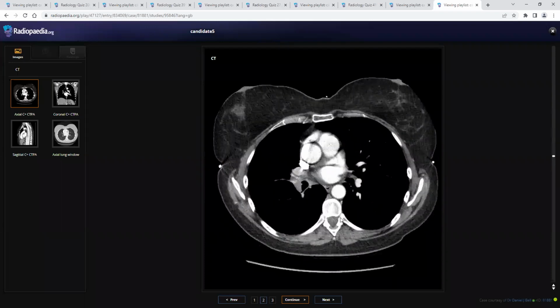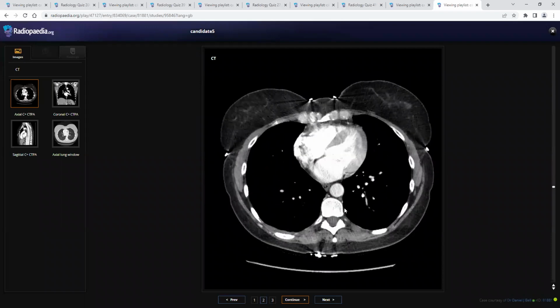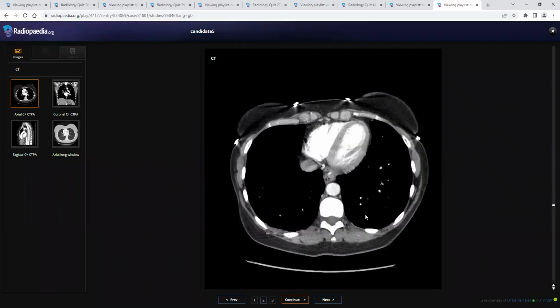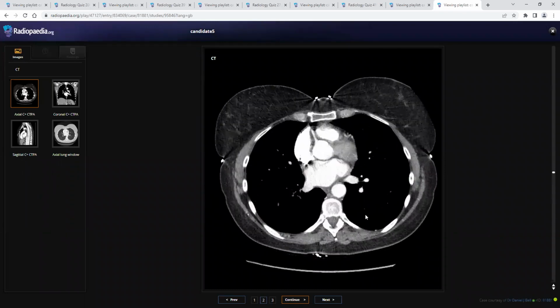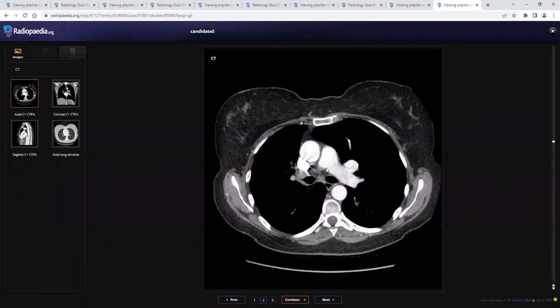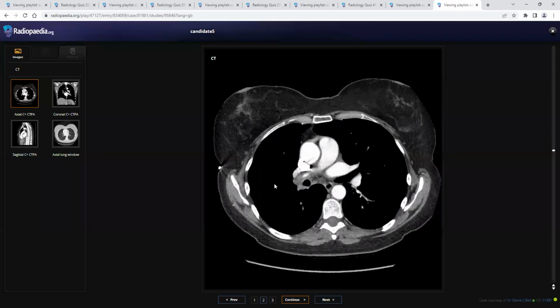The clinician is suspecting PE, and what do you tell them? The visualized pulmonary arteries and the segmental and subsegmental branches are all opacified. Just the right main pulmonary trunk is narrowed because of this circumferential soft tissue thickening.